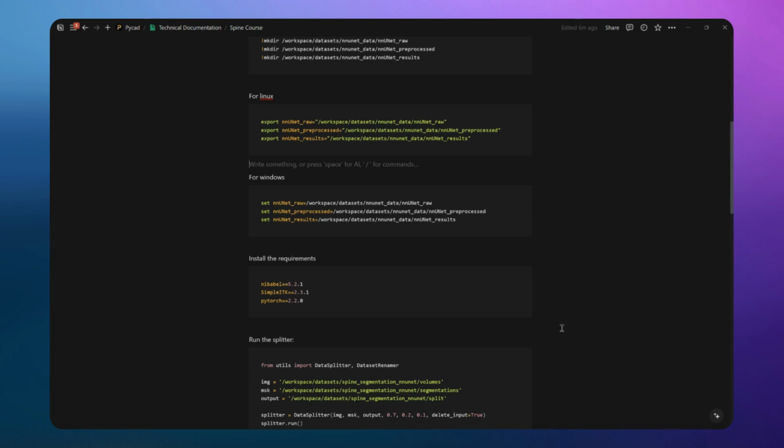And if we go to the pre-process part, nnunet will not accept these files, even if there is 0.0.1 as an error. It will not take it. So they should be the same. For this reason, I have already a code that corrects these. It will copy the metadata, which is the origin, spacing, orientation, from the volume or the scan, and paste them in the segmentation, so that if any of the segmentations do not have the exact metadata as the scan, then we can correct them.